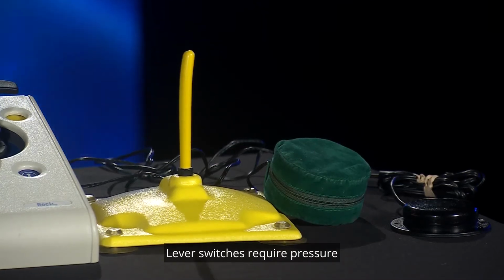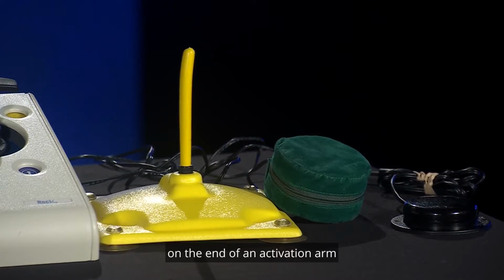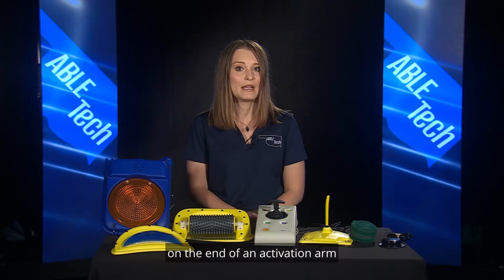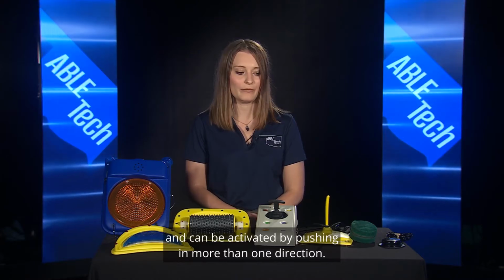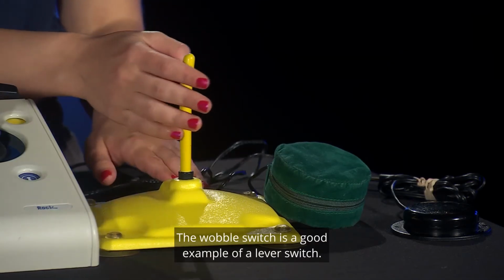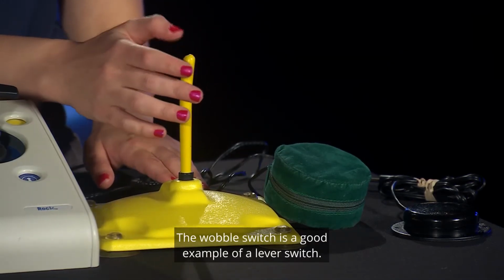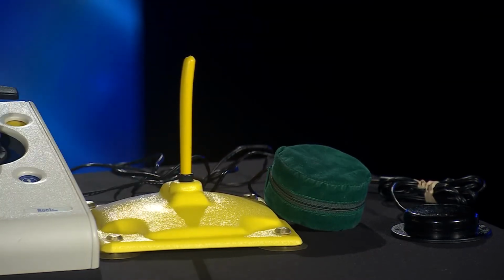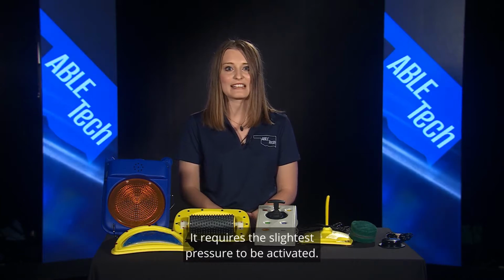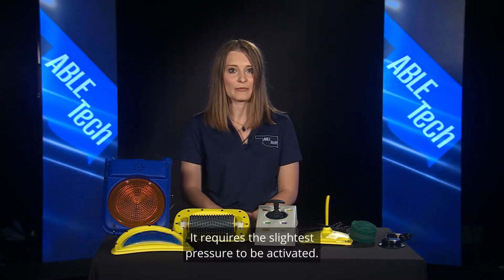Lever switches require pressure on the end of an activation arm and can be activated by pushing in more than one direction. The wobble switch is a good example of a lever switch. It requires the slightest pressure to be activated.